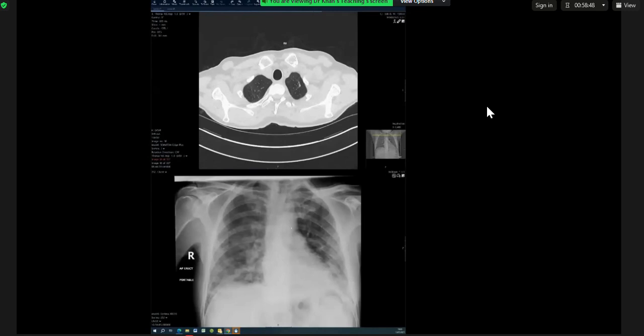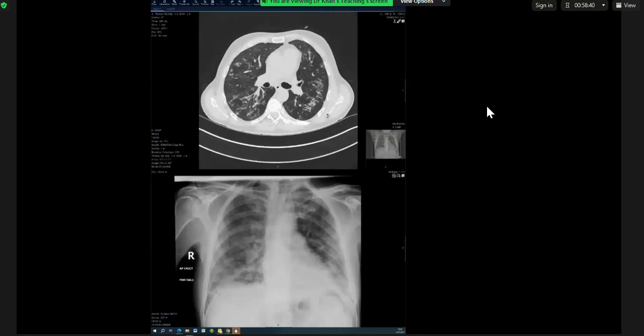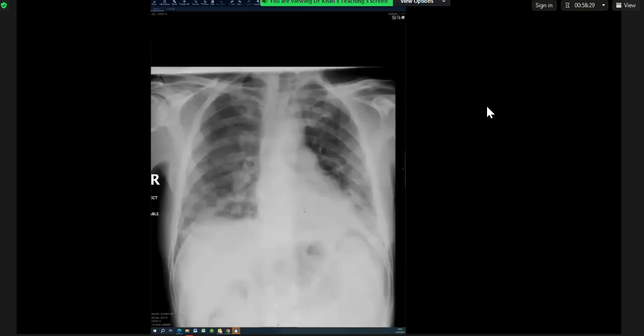What other kind of process could cause this appearance without giving the patient a fever? Wegener granulomatous may be one of the causes. Okay, so Wegener is a term no longer used. It's now called granulomatosis with polyangiitis. Yes. In the previous one, you were right to think of Wegener's, not in this one.